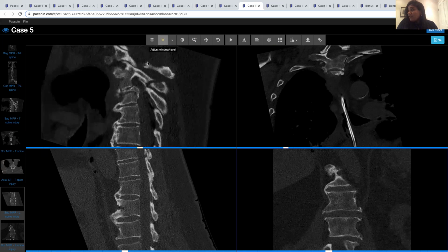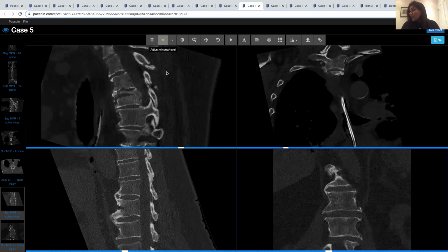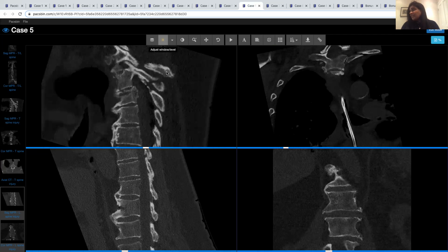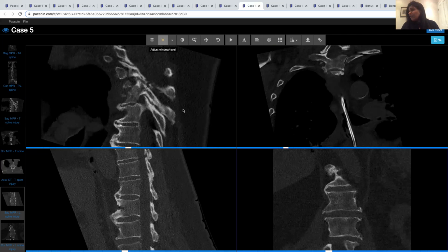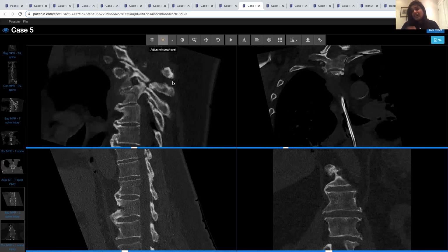Then look also above, you have a fracture of the T1 spinous process. So again, you're going to have involvement of that facet joint, with fracture through that facet joint as well, and disruption of that facet joint capsule. So we've got a multi-level Chance injury here, where we can see these horizontally orientated fractures, giving us evidence of osseous failure of the tension band, as well as the suggestion of ligamentous failure, because it will involve the facet joint capsules. And when we look at these abnormally long spinous processes that we often see in patients with DISH, if you look at the levels below this, those spinous processes are closer together. When we look at the levels of the fracture, they're widened, indicative of that ligamentous injury as well.